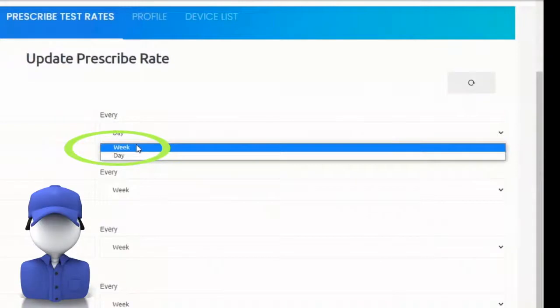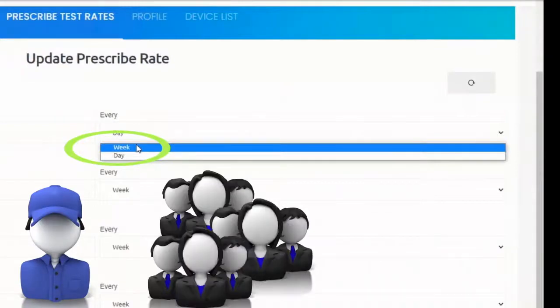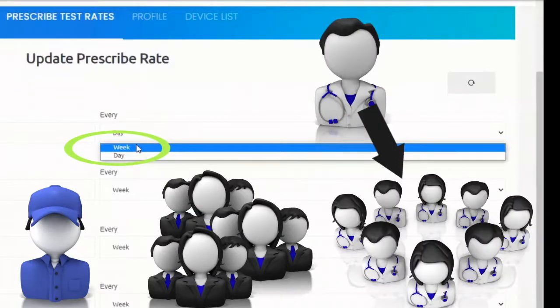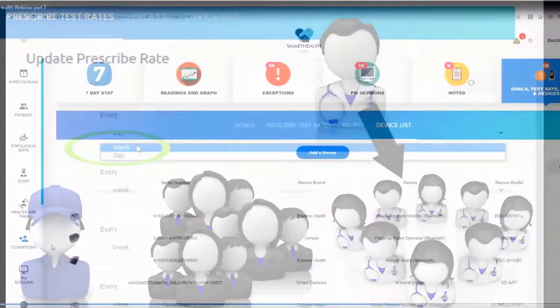The report focus can be for one patient, or you can run a report for the population. For ACO or insurance companies, the reporting could view one doctor's practice compared to other doctors in the area, or the report can be created to view one area compared to another area or state by state.